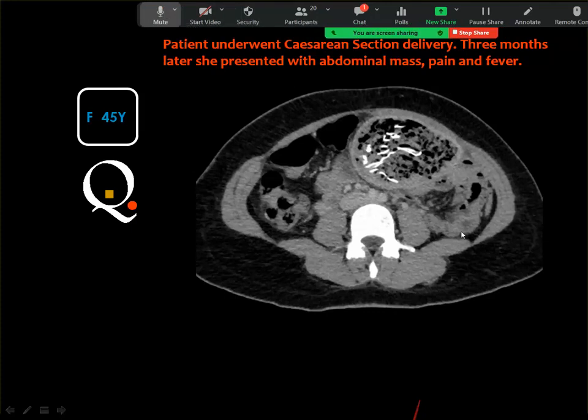Okay. And this is retained gauze. How can you know this missed towel? By the presence of radio-opaque material, which is present in every surgical gauze to identify it even by plain X-rays.